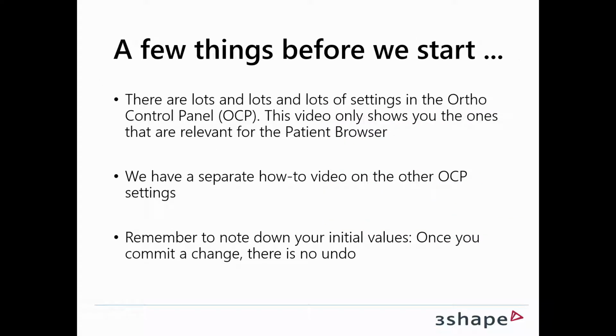A few things you need to know before we start. As you'll soon see, there are lots and lots of settings in the Ortho control panel, and this video only shows you the ones that are relevant for the patient browser. We actually do have a separate how-to video on all the other settings in the control panel. And remember to note down the changes that you make, because once you commit a change, there's no undo.